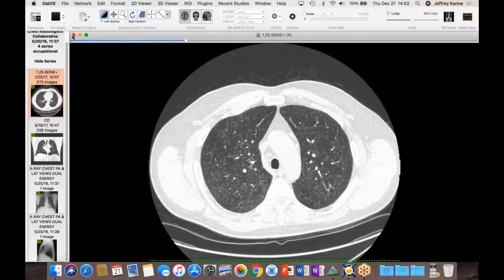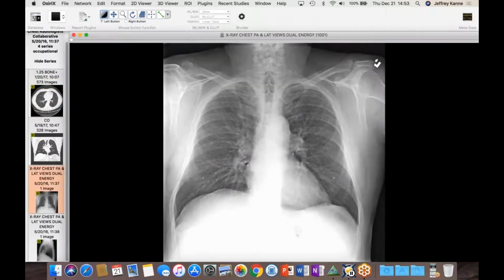No, that's a great idea, because iron is one of those potential non-fibrotic pneumoconioses. Right. So you see a lot of it without the scarring and so on associated with it. So non-fibrotic siderosis. Yeah. And if you look at this radiograph, you can see that upper lobe nodule, and this was a year before, so that's probably a lymph node or some non-calcified granuloma. But the lungs themselves, I'm on a little screen right now, but you don't really see them, which is typical of RB because they're so poorly defined.